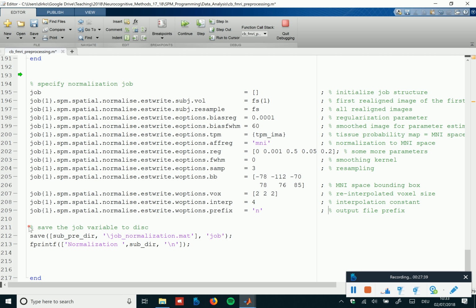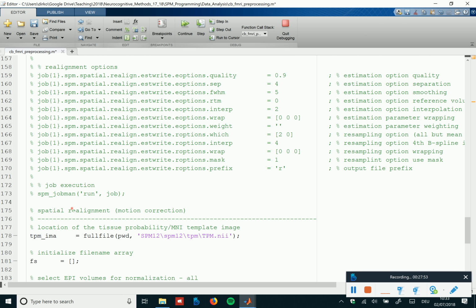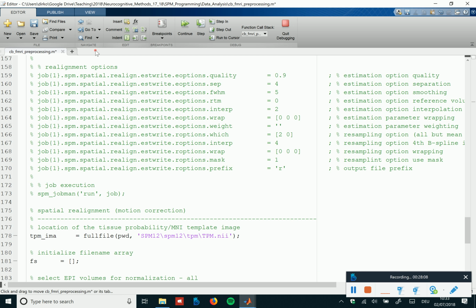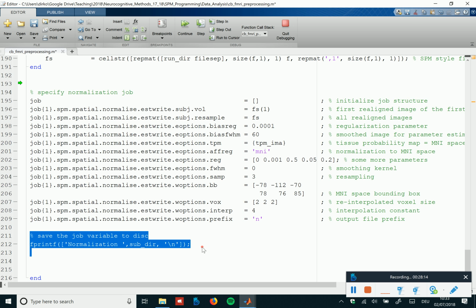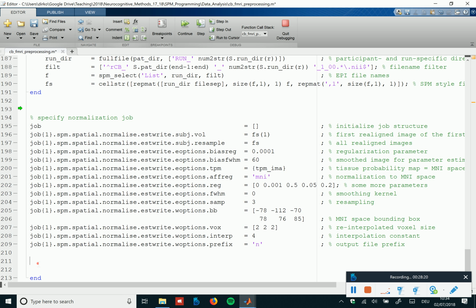So, and here we also save the job file. We didn't save the other one. Let's not do it. It's in the script anyway. But we might also put information in there. Although I don't think that subdirectory actually is something we knew before, so let's rather delete it. Of course, you can do it if you want. And then let's try to execute this one.